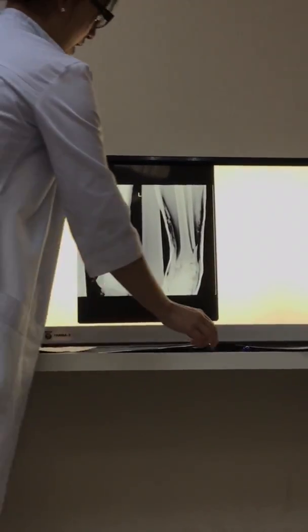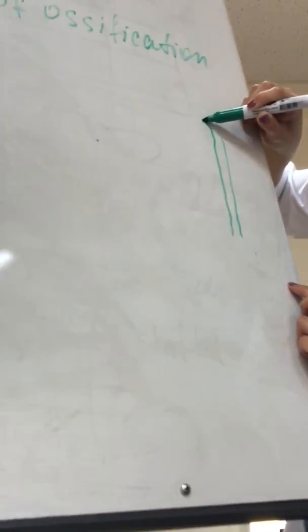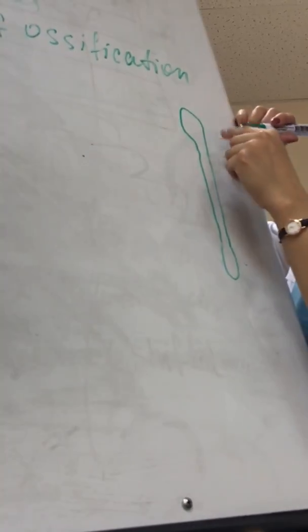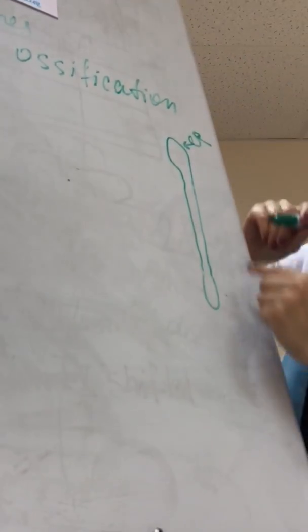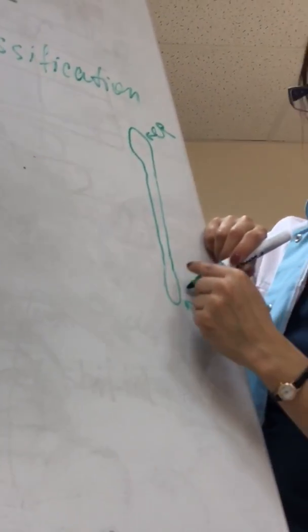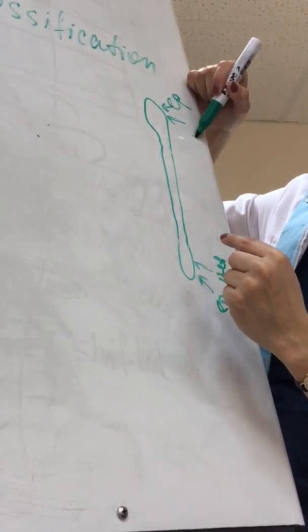You know that bones, femur, which bone is it? Which bone? Fibula, okay. Fibula and femur has diaphysis. Yes, this is diaphysis, and let's imagine this bone. Tube-like bones, they have 2 epiphyses. This will be proximal, this will be distal epiphysis, and after epiphysis, here will be metaphysis. You know it? Yes. Here will be metaphysis.